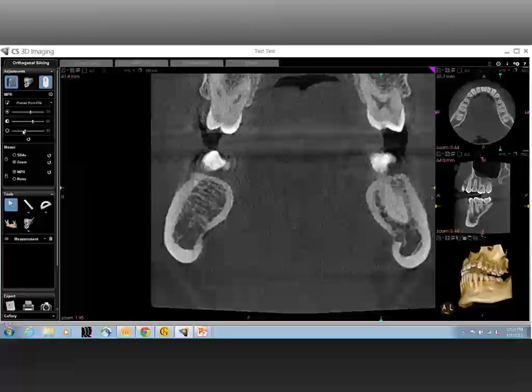Thank you very much. And I should have introduced this as being a cursory overview of the mandible. This is not a full radiology read. We're looking with Carestream University to do short videos that cover important areas critical to cone beam CT, but to do them in brief online presentations. So in summary of what you were saying, number one was integrity of the cortical bone. Number two was structure of the cancellous bone. And number three was the trabeculation pattern. What other anatomical structures, if any, do you focus in on?